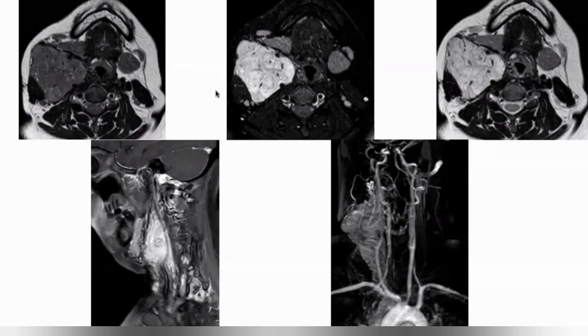So as you said, this is located in the carotid space, and it's splaying the vessels. It shows some hyperintense signal on the T2 weighted images, and it's showing avid contrast enhancement. So paragangliomas show very avid contrast enhancement. That is the basic teaching point as compared to schwannomas. Schwannomas usually enhance a little bit delayed, and they don't enhance as much as this one.